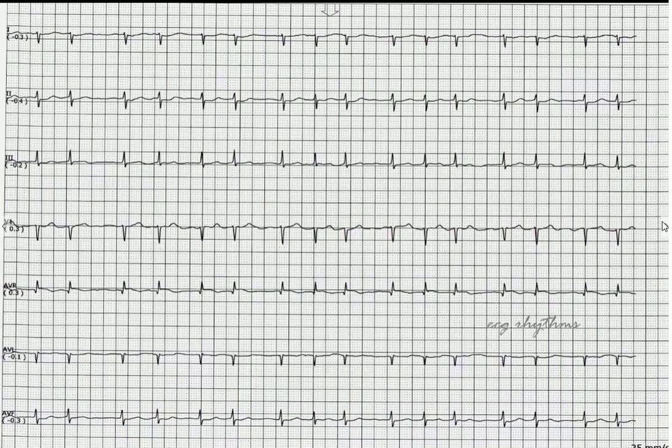Look at this strip. Look closely and move backwards. Do you see something strange with this atrial fibrillation? How come this AFib becomes a regular rhythm? AFib by definition must be irregular. How did this happen?